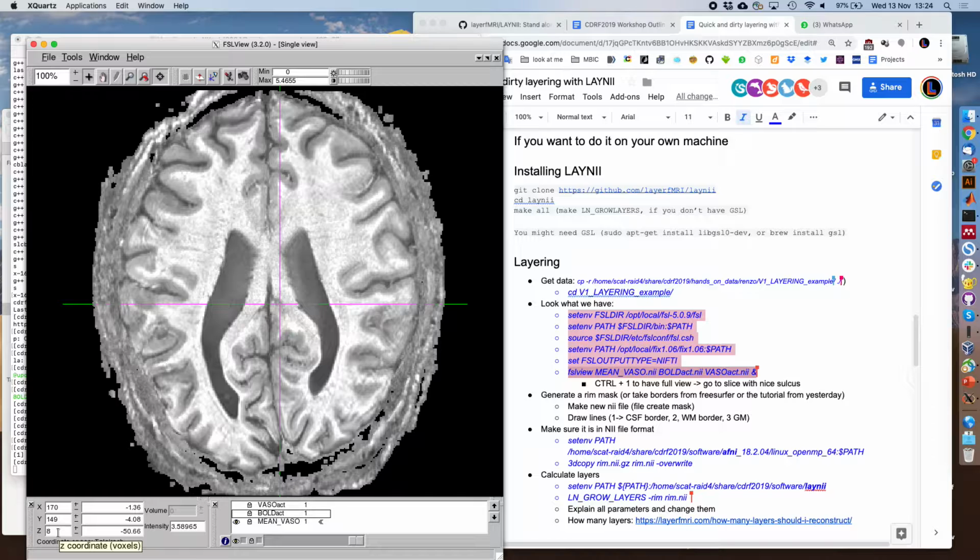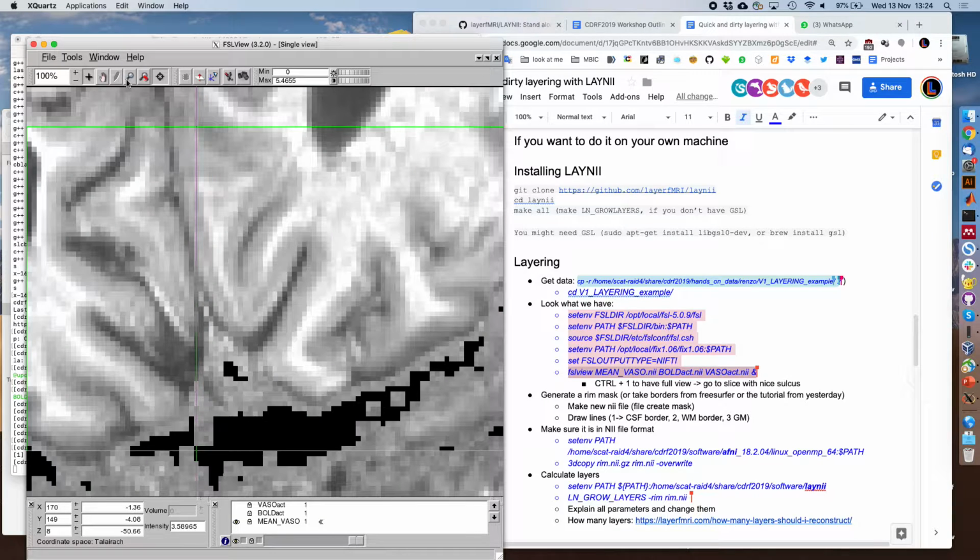This is a data set that was acquired with the great help from Sean Merritt at Terra in Bethesda. And the sequence that this was, or the readout that this was acquired with, is from the Bonn group, specifically Rüdiger Stirnberg. So it's a segmented 3D EPI. That's why you can go to these very high matrix sizes without a lot of blurring in the phase encoding direction. So I would like to focus on the visual part down there. So I zoom in. You can zoom in either with the left mouse by just drag and dropping a certain area, or you use the magnification glass up there.